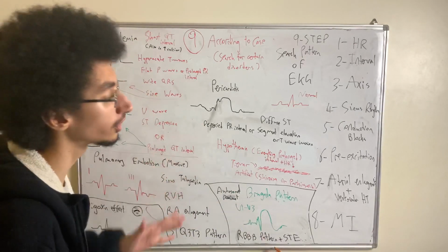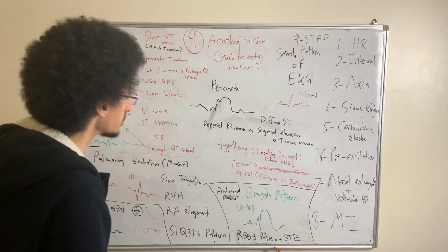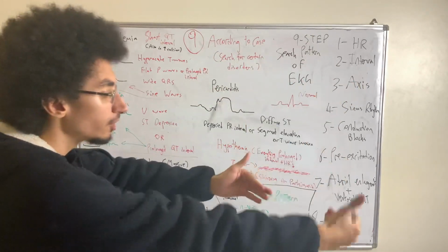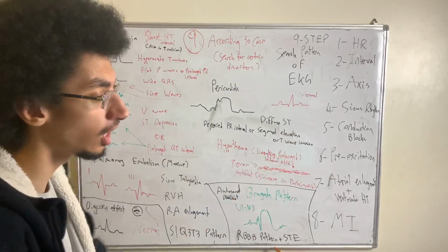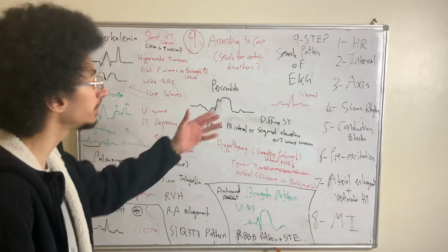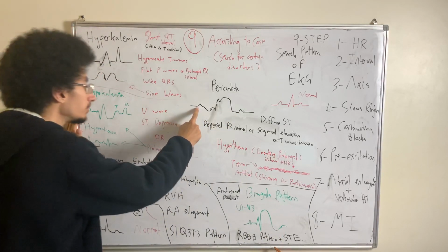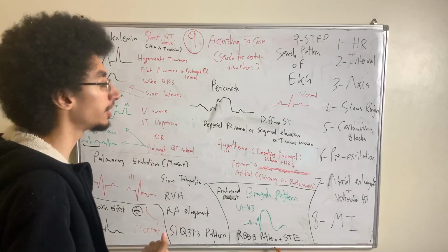The final cardiac disorder that we talk about that may be seen in EKG is pericarditis, inflammation of the pericardium. The pericardium meaning the outer layer of the heart, followed by myocardium, followed by endocardium. In the case of pericarditis, due to a viral cause usually, it will give us a specific finding. It can present in this patient with a depressed PR interval. So look at this reading. You can notice following a P wave, you can see that the PR interval is depressed. This is a very specific finding of pericarditis.